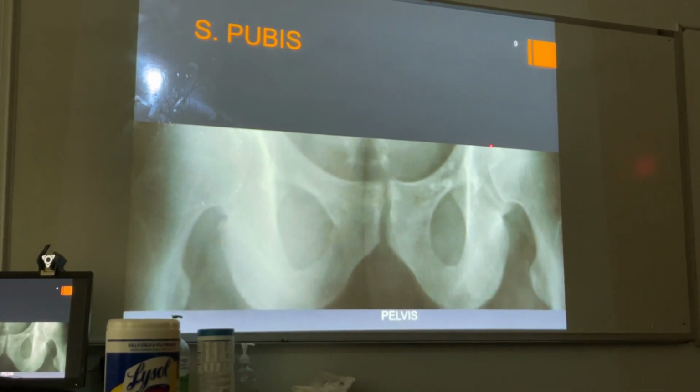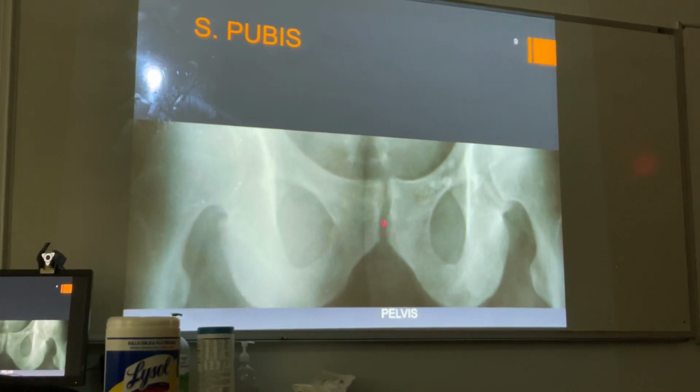So when I'm evaluating the hip joints, I want to go around and take a good look at the symphysis pubis. The idea in the pelvis, because it is a ring structure, is that those 6 or 7 anatomic areas become important. Now, when you look at it, this transverse dimension of the obturator foramen is wider than this. It's just a good example of that. You can get a greater discrepancy, and I don't know what to make of it. It's a visual observation. I don't know what the Gonstead people or the Thompson people would say. Is it a pelvic distortion, rotated some way? I don't know. I'm just saying I've made the observation. What you do with it, if you weren't one of those practitioners, you wouldn't even care.